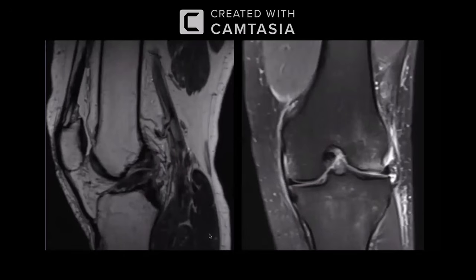I've done an MR for this case also. Of course, MRI in short cases is not routine, but I'm just correlating all my cases with an MR so that you get the correlation, which you will not get in a plain radiograph, especially in the exams. So do you see anything in this case?